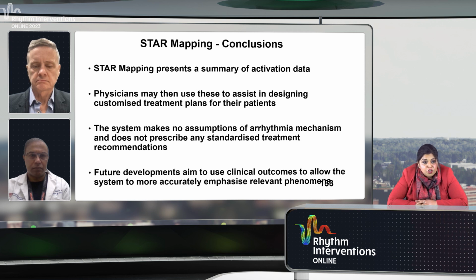It's up to the physician and the operator to look at those patterns, look at the early sites, and then look at the voltage and decide a better strategy for that patient, rather than just taking an anatomical approach. And there are definitely future developments looking at clinical outcomes, and we are looking forward to being part of the study that's going to evaluate the STAR technology for our redo population.